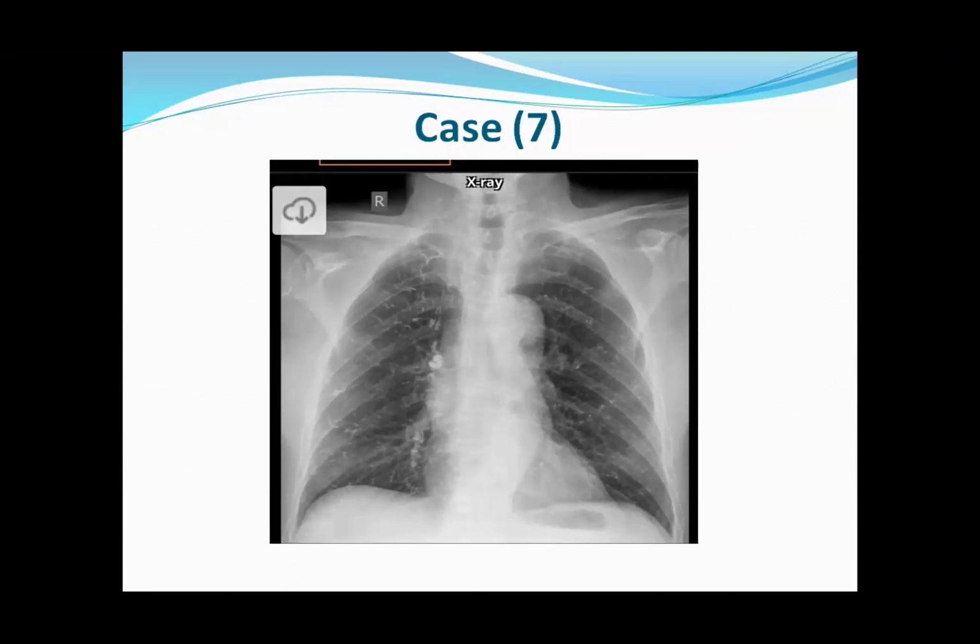Multiple embolization coils within bilateral lung fields. Okay, these are multiple radiopaque linear shadows. This is possibly arising as a result of a previous procedure. I would like to know whether he has had any procedure like vertebroplasty. If that is so, these are cement embolism, which have migrated from the vertebra to the pulmonary circulation.